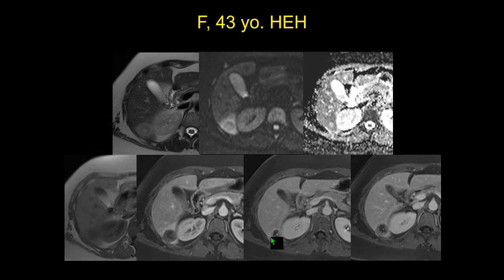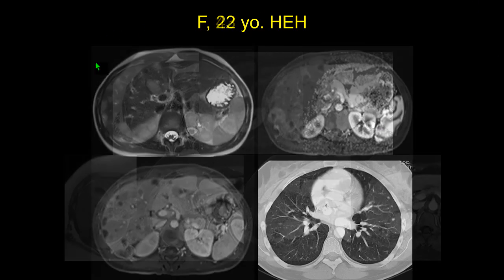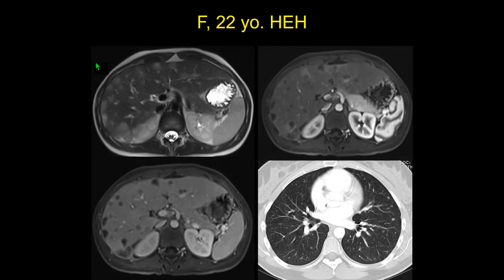So the lesion can be single, very rare, but when you see this target sign, think about epithelioid hemangioendothelioma. Typically right lobe, subcapsular, the enhancing rim, and the central desmoplastic component that you can see here. There's a difference in the ADC map. We can see this target sign of this lesion. Very typical. It's quite unusual to see only one lesion. More often we see many more lesions.